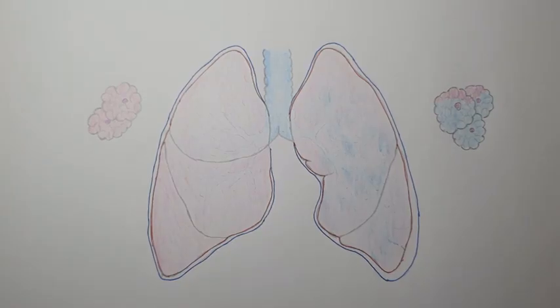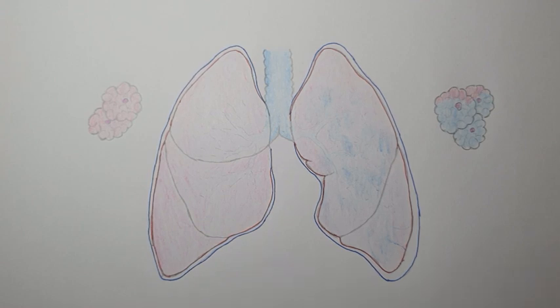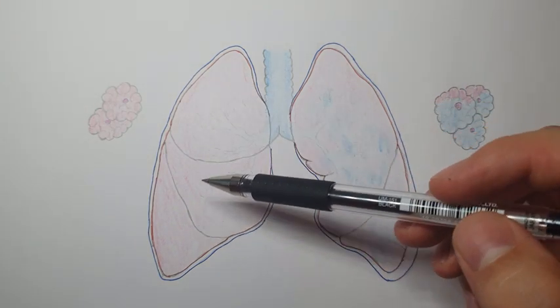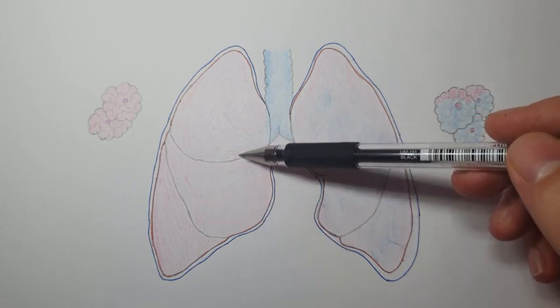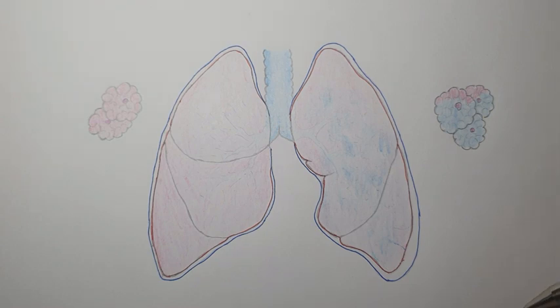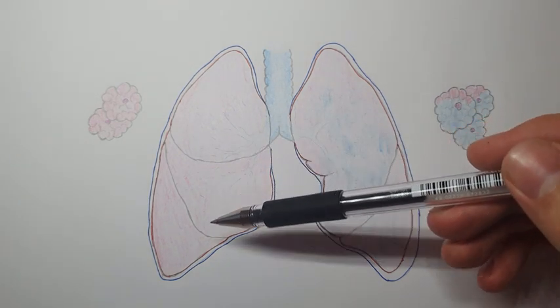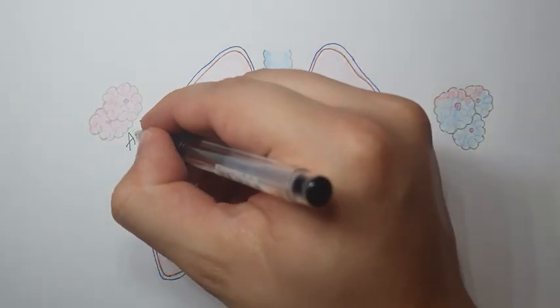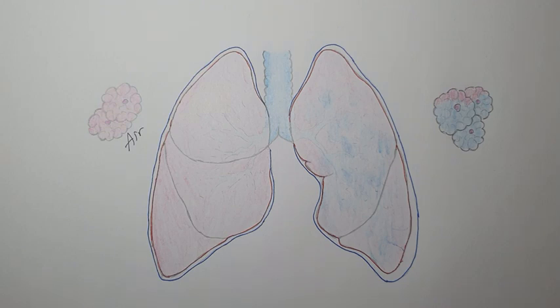Hello. So before we go into pulmonary edema X-rays, or before we show some examples, first we will analyze some important features. So here we have a normal lung field. We see the normal vascular marking and the normal tissue of the lung. And in this normal tissue, the alveoli are filled with air. So there is air in the lung tissue.